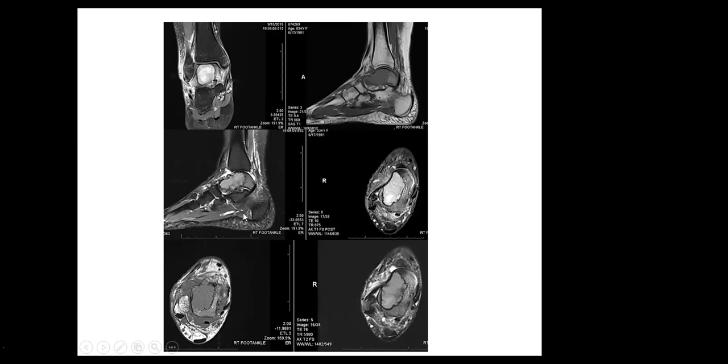So this is a giant cell tumor of the talus, okay? And you could tell the diagnosis just based on the radiographs. The MRI scan was done here just to assess the direction of the biopsy and assess for cortical break. So really, the role of the MRI is for local staging for malignant tumors, but it is also useful for deciding which way to go in for the biopsy. Okay. Now, do we have another resident?